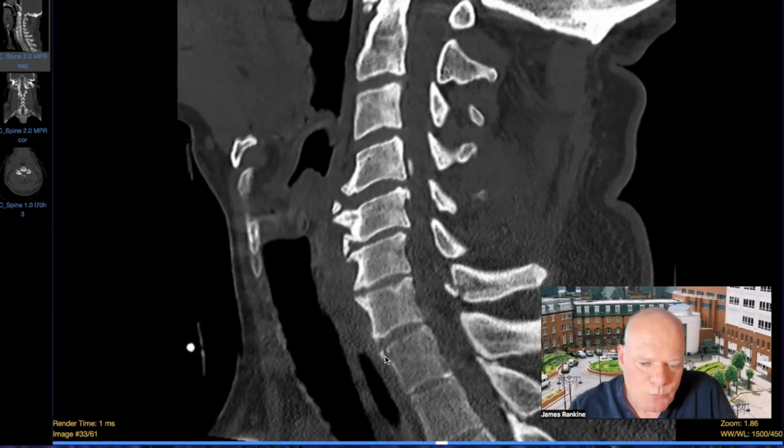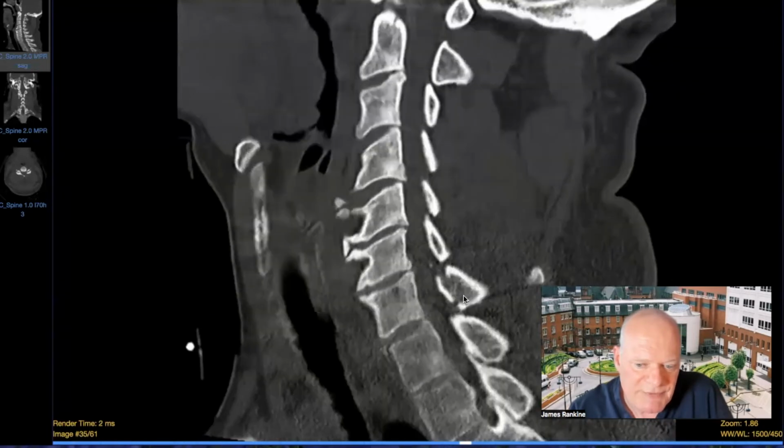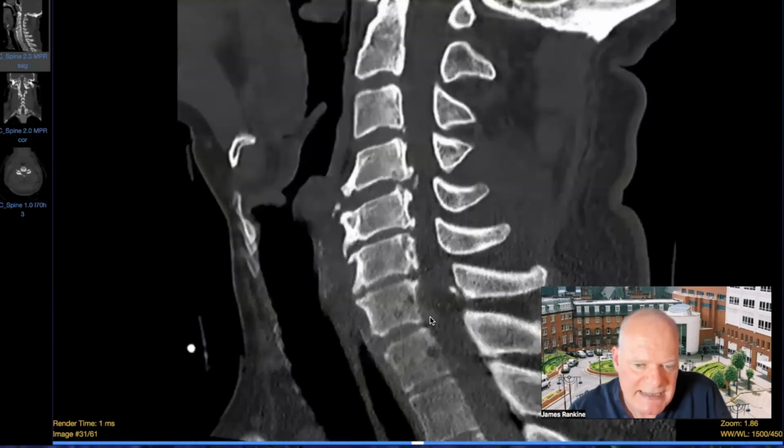What you have to think is, what position would the spine have been in if this was going to have been a flexion injury? This would have to have driven all the way down here. There aren't any osteophytes. It's an awful long way for this bit of bone here to come down and push that off. What's much more likely, of course, is that it's just a tiny flake that's pulled off from the anterior longitudinal ligament. And we've got this clear evidence here of a compressive injury through the back. So again, this is a hyperextension injury.